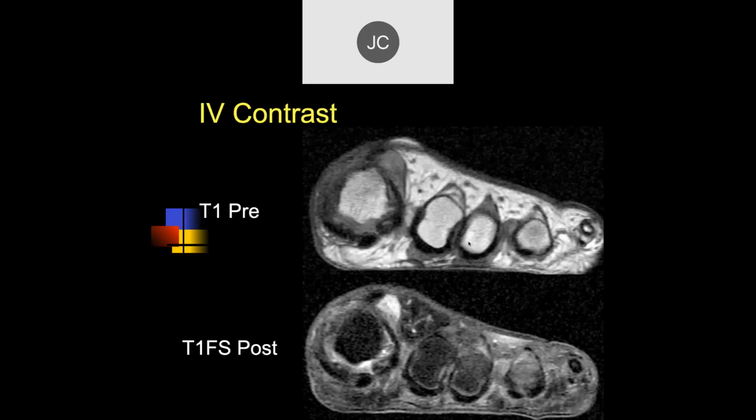Let's see. Oleg, what do you think of this particular case, this patient? The lesion that people were concerned about is this lesion.